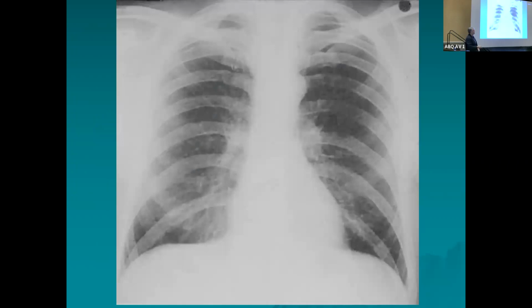Now here you can look at it and you think, wow, I don't see any vertebral bodies out in here, really kind of a shaded area. I don't see any scapula over this side, not too bad through here, but it's underpenetrated, not really the greatest quality of film.